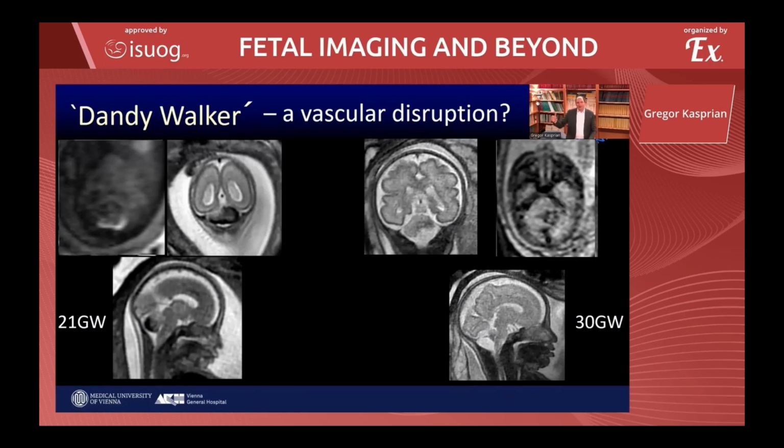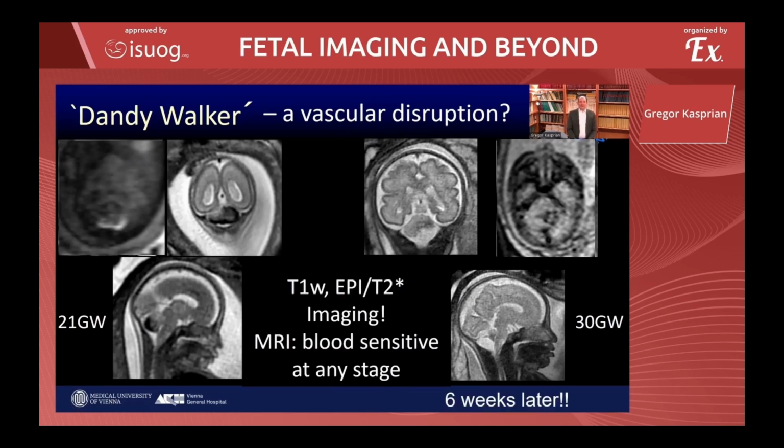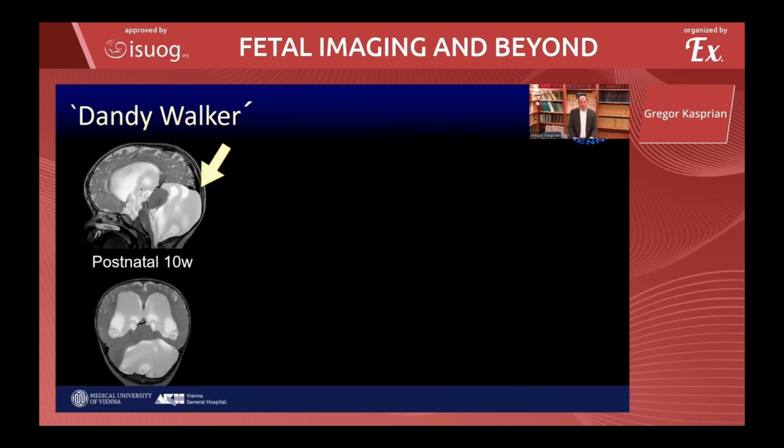In the late chronic stages, where the hemorrhage happened weeks before, we still have at 30 weeks a technique which can pick up the remnants of that hemorrhage and make clear that this defect here was not a pure ischemia, it was a hemorrhage. And that plays a certain role because we see more and more of those cases where we think, well, there is a hydrocephalus here, the cerebellum looks abnormal, even the torcula is higher. That is a neonatal image of a classical Dandy-Walker malformation.